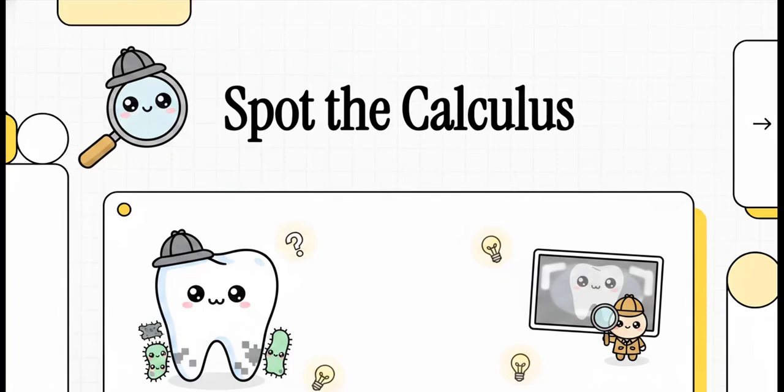All right, let's play dental detective today. We've got a single radiograph, and our mission, should we choose to accept it, is to hunt down the hidden clues of calculus. It's a fun little diagnostic challenge, so let's jump right in and see what we can find.